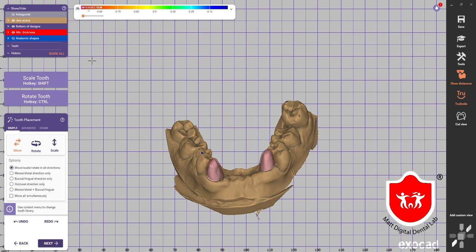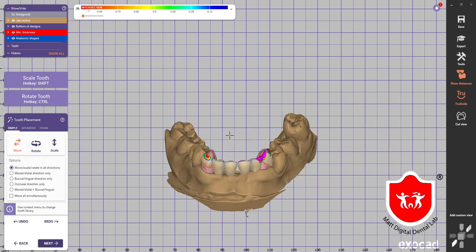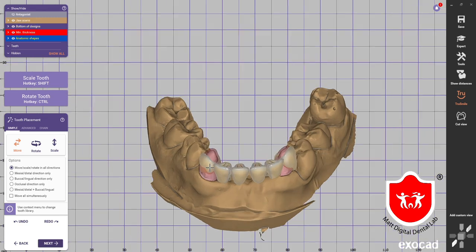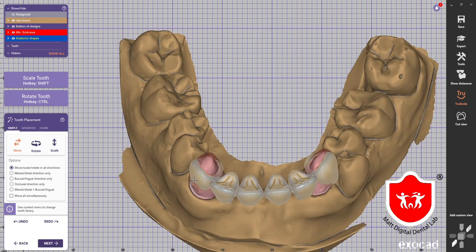Okay, in this stage we will call the libraries. Now we need to reposition it. You can use Ctrl and Shift to navigate through the repositioning menu.